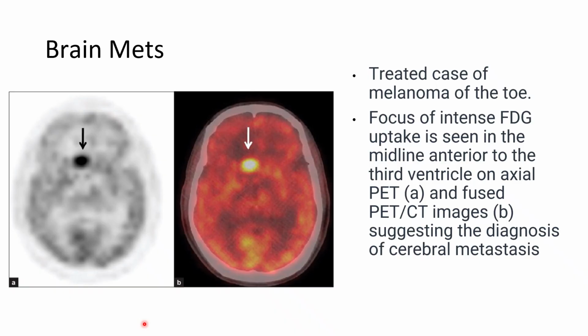That's the problem with brain metastases with FDG, is that the brain is already hot and the mets take up extra glucose. So it will show up extra hot, but it's hard sometimes to get that differentiation. It's also difficult to see if it's mets or some other localized infection or inflammation because it really won't tell the difference.